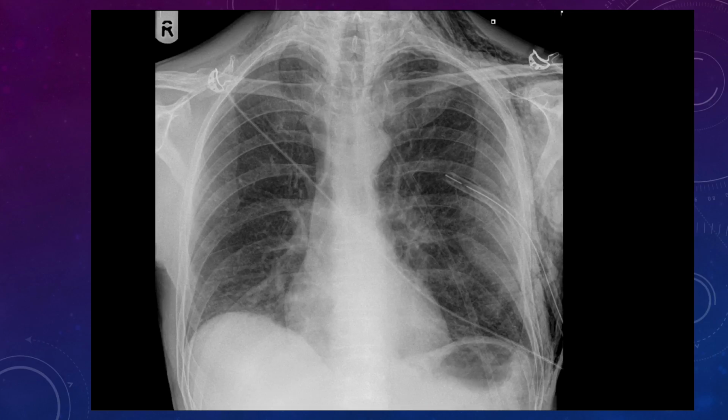Okay, this patient has had a chest drain in. We've got multiple fractured ribs on the left side. Probably had a pneumothorax. Popped a chest drain in to reinflate the lung. Extensive surgical emphysema, tracking round to the right side now.